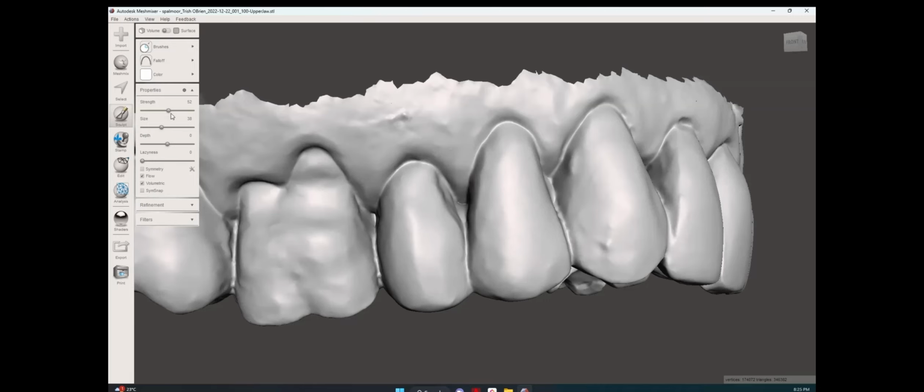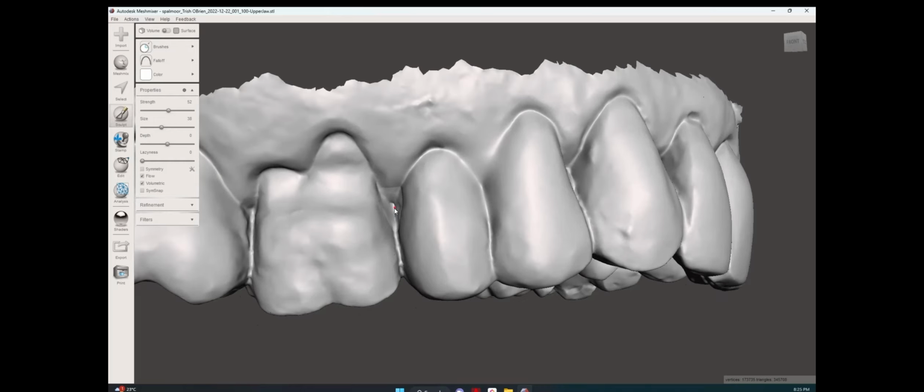So the strength for this one, about 50%. You can use whatever you prefer, because you can do it as slow or as fast as you like. But I use about 52 for the volume changes, and that's your undercuts. Click it. All right. Go to the deepest part and click on it, and that's all there is to it. All right. All the undercuts.